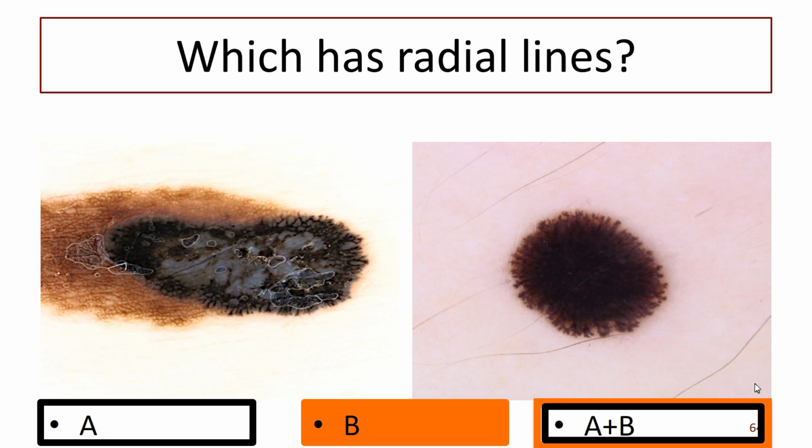So the radial pattern means the lines are coming out from the edge. But we're also seeing that the beautiful, even reticular pattern is replaced by an uneven, chaotic, multicoloured one; at least it's got black and a kind of bluish-grey colour, and the lines are not the same. They kind of disappear here, and they've got clods on the end. Can we have a picture of a line with a clod on the end? Does anyone know what a line with a clod on the end is called? A pseudopod. And this has the same, but this is benign because it's all the way around.